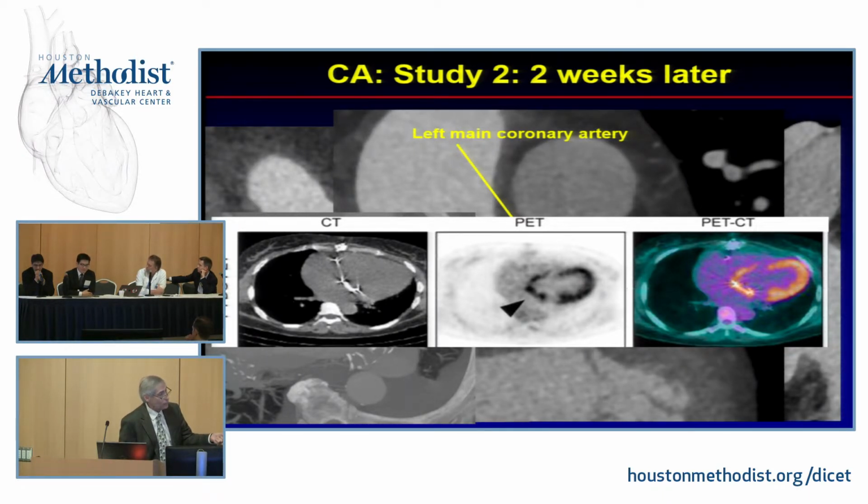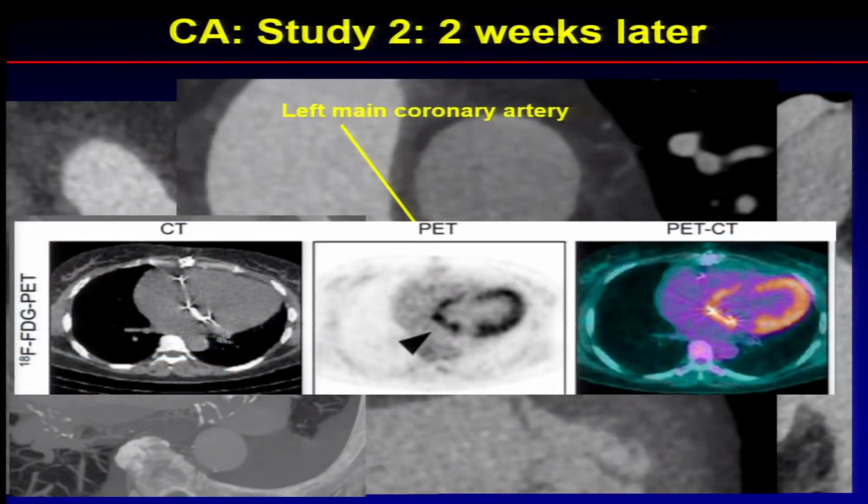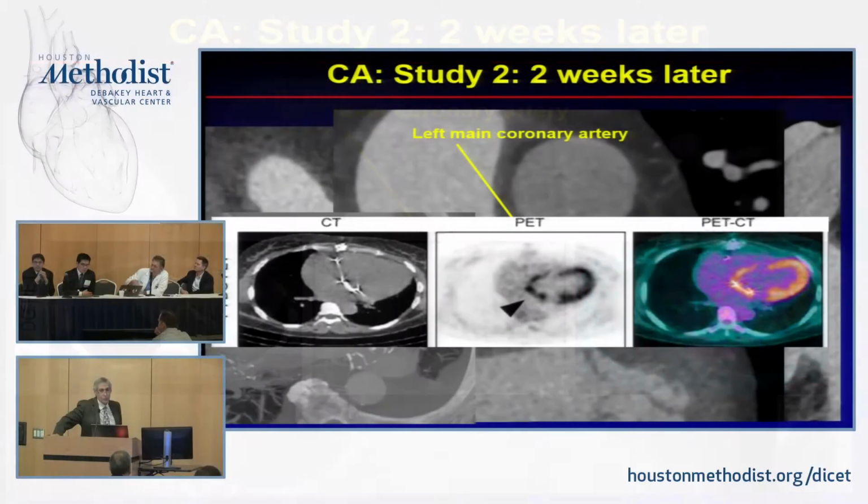This is intensely hot, this area in here. And this patient actually did have endocarditis. So with the introduction of PET, that's something we really want to get into when we start doing this, because PET is a very good way to help tell whether those accumulations that are higher in Hounsfield units than what we would anticipate are just post-operative changes, or are they really infectious?